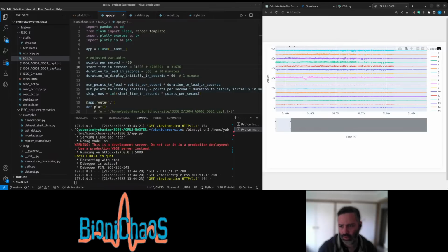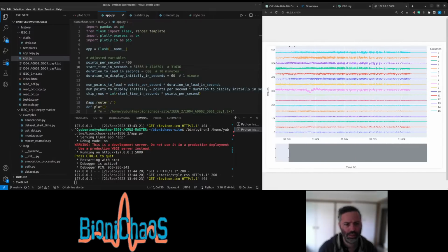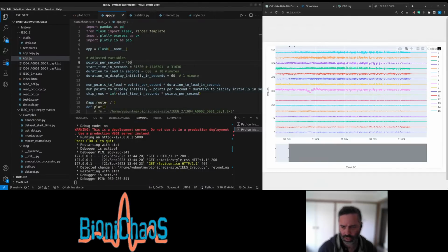Right. So there's something there. Looks like it's starting a bit prior. So I don't know what's up with that. Just give a few seconds.